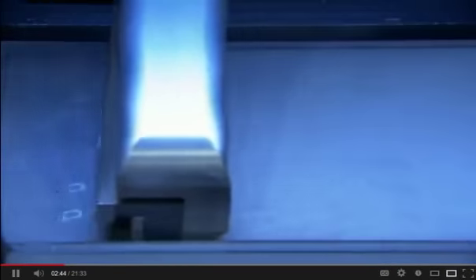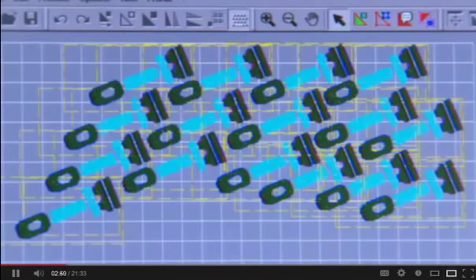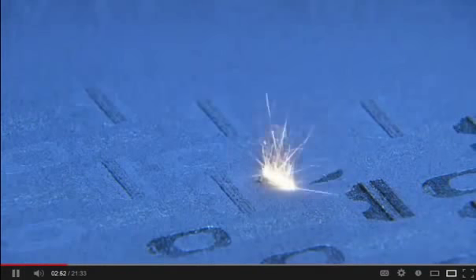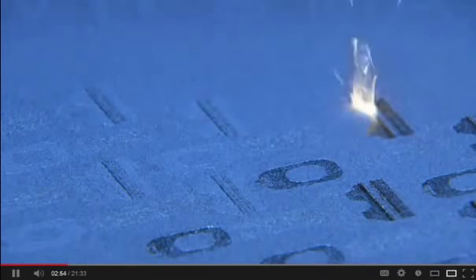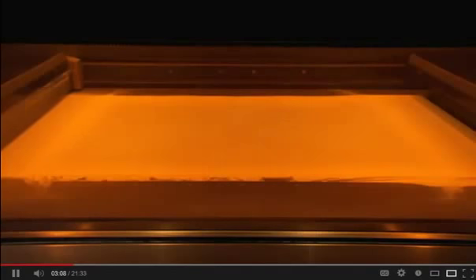The computer, which recorded the bone cuts, guides a 3D printer to produce plastic templates for both the femur and tibia. The surgeon will use these to repeat the exact same cuts in real life. The 3D printer applies a layer of powdered plastic. Then, following the computer model, solidifies select areas with a laser. This process keeps repeating, building up the shape of these surgical templates layer by layer.